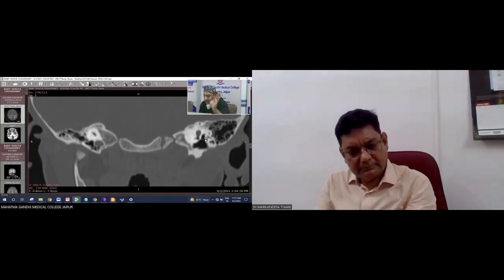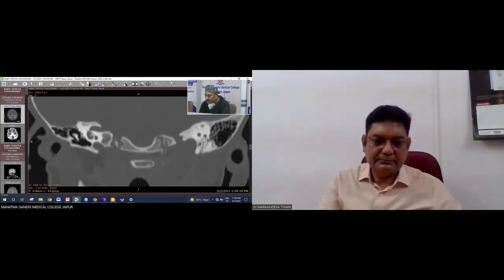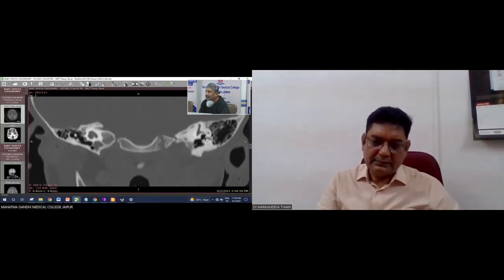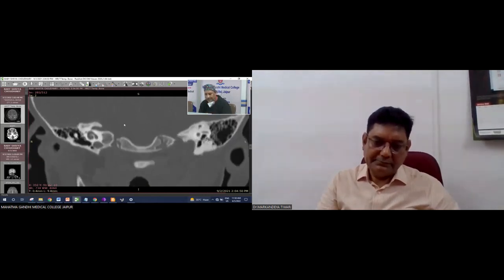So all these are important. For looking at the CT scan to give the optimum results of the cochlear implant, one must sit with the CT scan at least for half an hour to get the exact submillimetric three-dimensional information, which can complicate your cochlear implant surgery, which can have a significant impact on the overall implantation, surgical aspect, difficulties, or changing the surgical technique of the implantation.